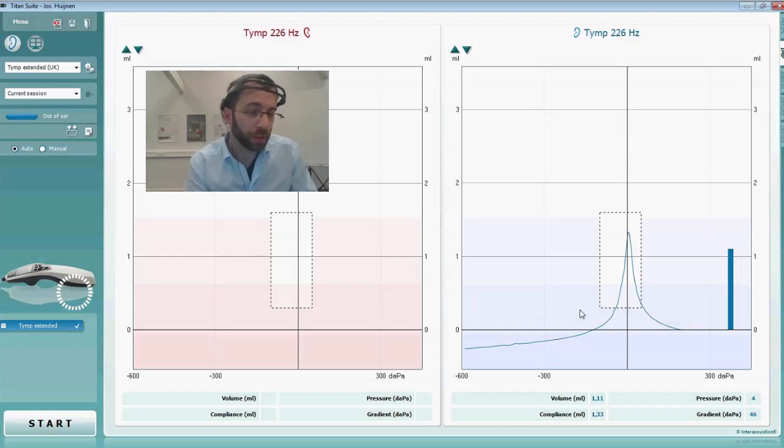I didn't mention before, but experience shows that if you can still find a peak, then usually it corresponds to almost no air-bone gap in the audiogram. While if it is a fully flat curve, then an air-bone gap is more likely to appear. And I think that for ENT doctors, this is the difference between either taking action on shorter notice or waiting a little bit longer. So if there is still somewhat of a movability in the far negative region, then you would tell a patient to come back later and test again before you consider an intervention.